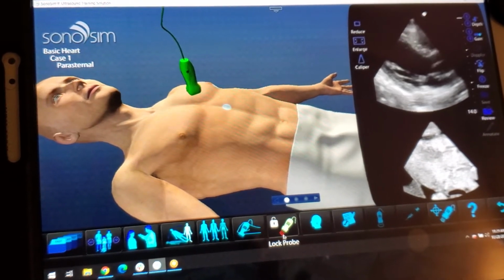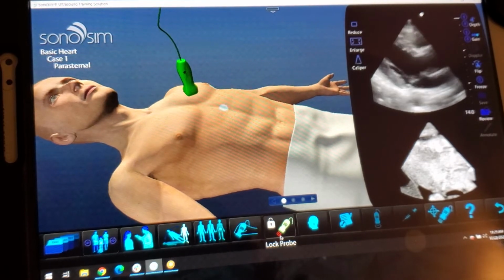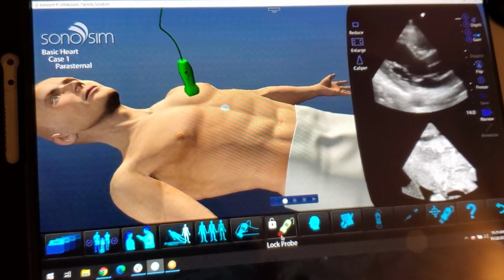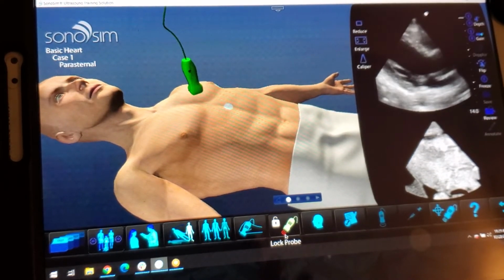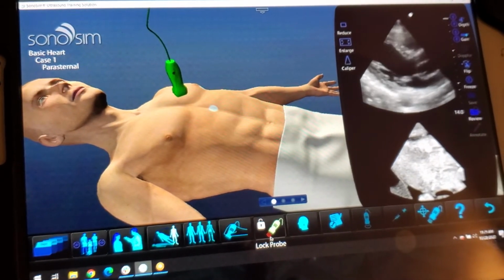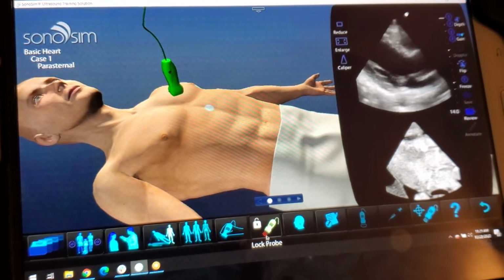But if I want to see if there's something abnormal, any pathology, just take a closer look at this ultrasound window. Obviously, we're scanning in a virtual environment, so there are a few limitations, like we lack some translation. We lose a few degrees of movement, but these are all real patients, real images, real scans that we've collected. There's no CGI, no animation.